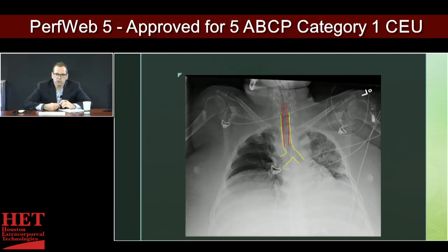And then this patient looks like they have some sort of a process primarily involving the left. I would suspect an aspiration or maybe the early stages of ARDS or even a significant pneumonia. But you want to look at everything on there. So identify the patient, look at the bony structures, look at the soft tissues, look at the lines.